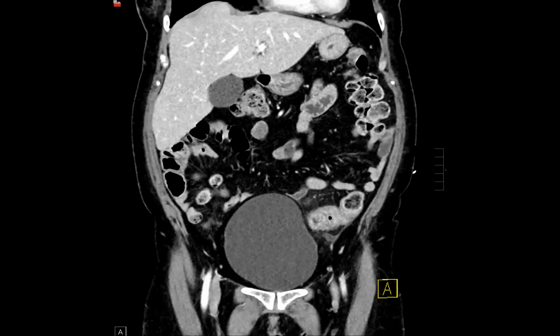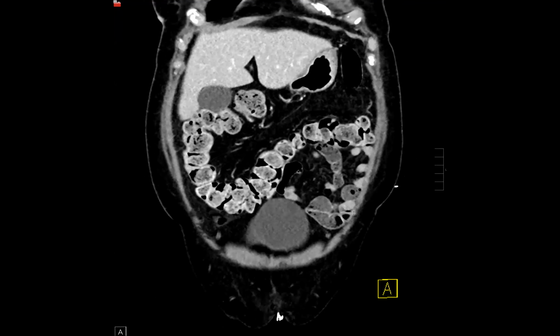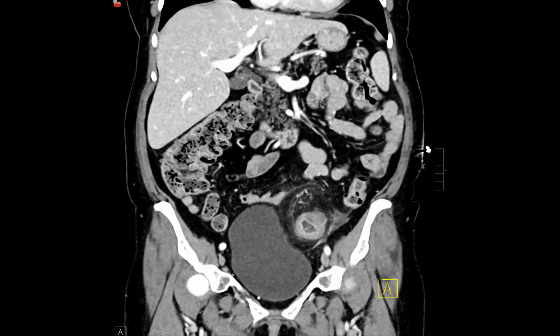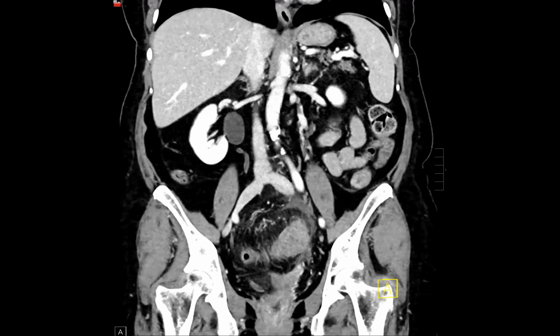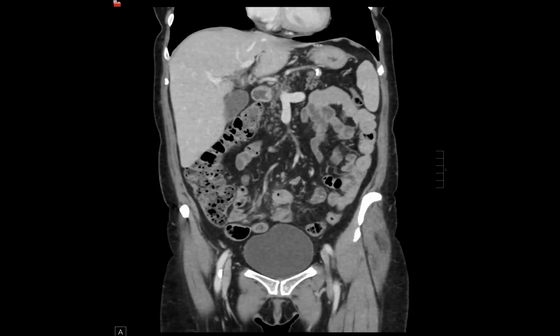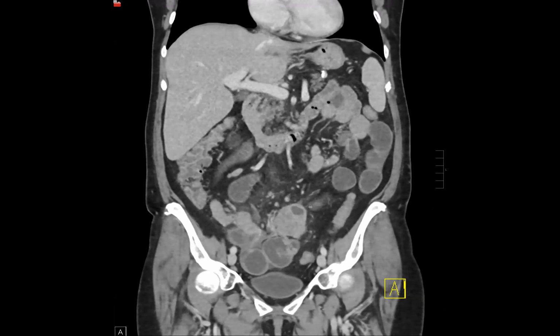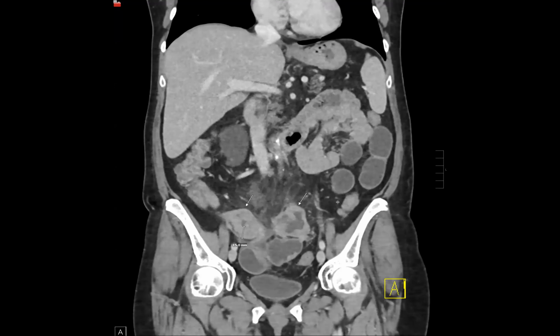This patient came with abdominal pain, had diverticulitis, and then showed up again. And the diverticulitis part was better, but the abdomen, this is post-intervention. There was other area of abnormal bowel findings that you see here.